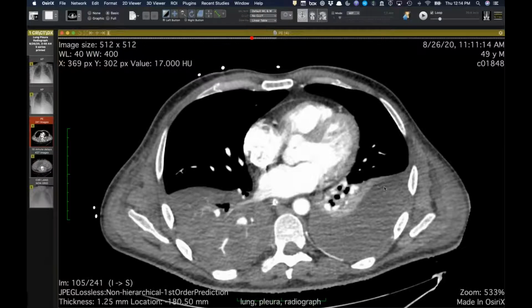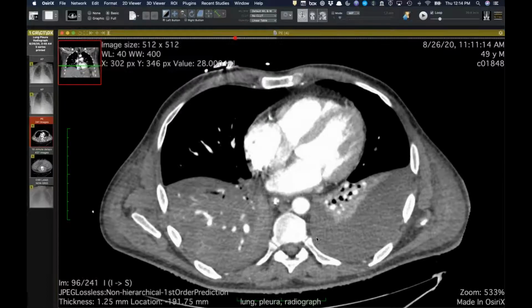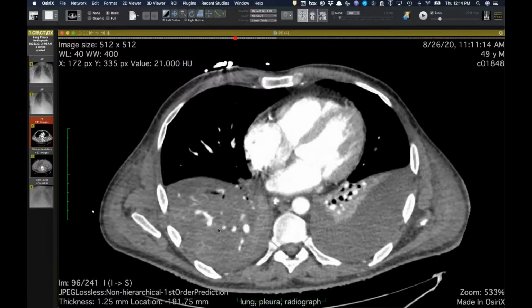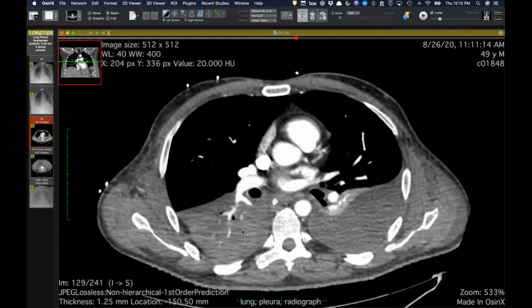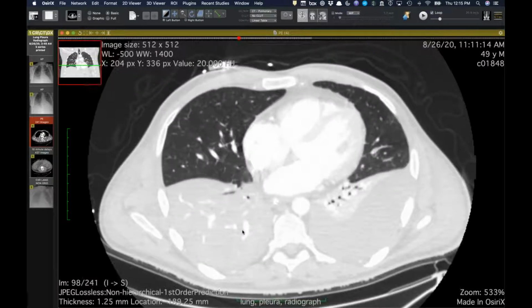But on the left, there is a medium-sized effusion, about similar in total volume to the right lung consolidation. I think it's a great example of enhancing passive atelectasis versus just this socked-in right lower lobe. So this is presumably pneumonia or aspiration. I'm not exactly sure, he's got a lot of other issues as well.